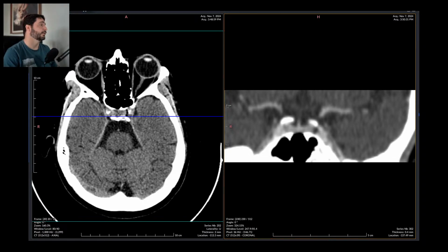So just to be sure, and it's even flagged as an emergency scan. Go figure. So not going to fight it, just going to copy and paste my template and be on my way just like that. They did it.